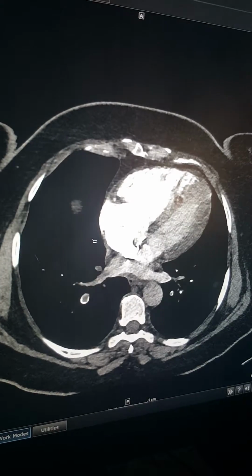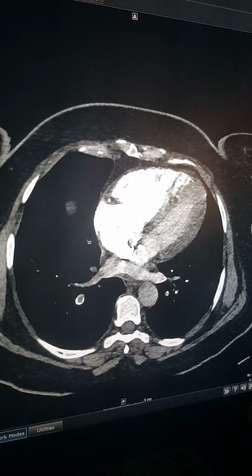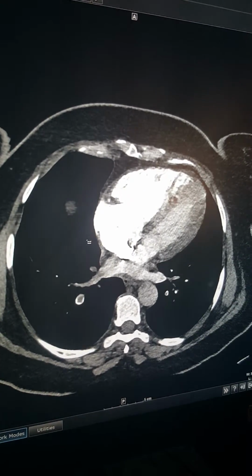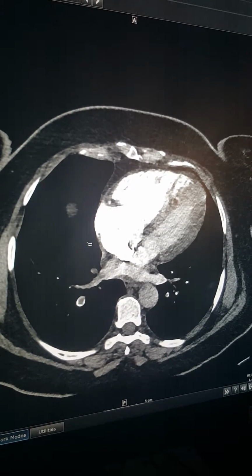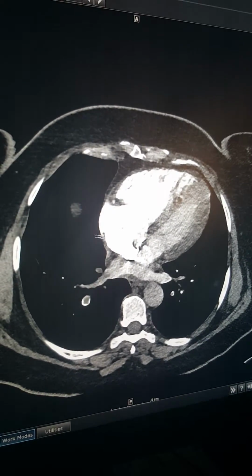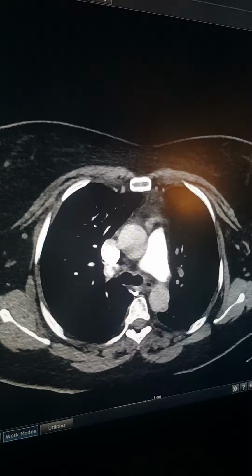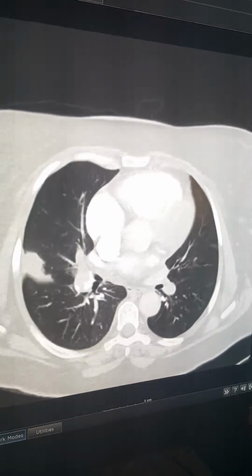We try to elaborate the signs, but definitely this patient has a definite massive pulmonary embolism: all the lobes and segmental and subsegmental branches have been affected, and there is a secondary effect of cardiac strain and pulmonary infarct. So nothing is left to keep it away from massive. I think this has emphasized the importance of discussion between radiologist and clinician.